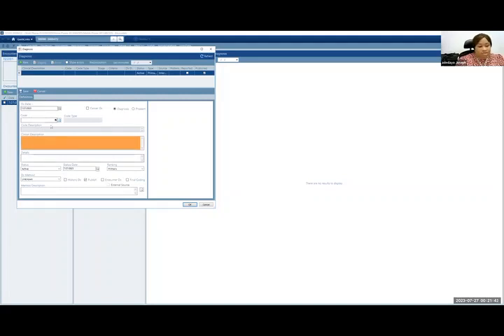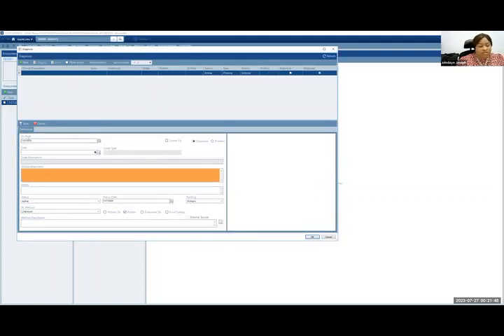And I'm going to use the most common and the most complicated one, which is breast. So when you open this diagnosis workspace, it looks like this, and I'm going to just enlarge it a little bit. Starting with the date, ideally, if you don't do anything, it's going to leave it as today's date. But what that then does is that if you want to really check patients who were diagnosed with breast cancer between January and October 2023, you won't have accurate dates because this is not the date she was diagnosed. This is just the date you are seeing the patient.